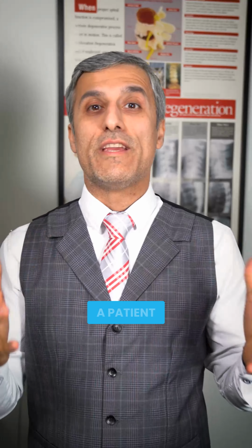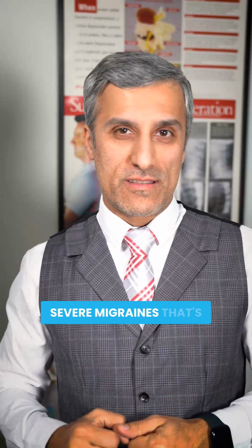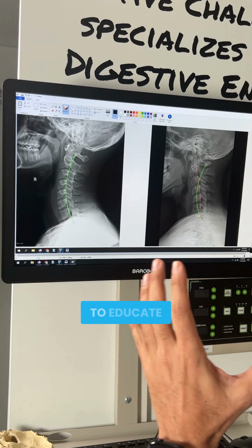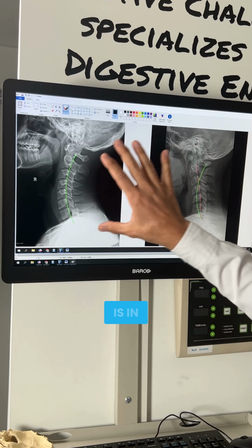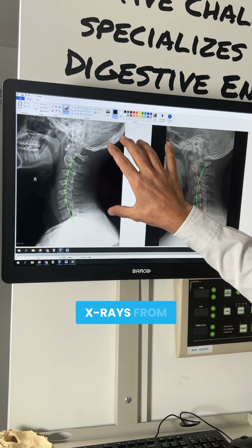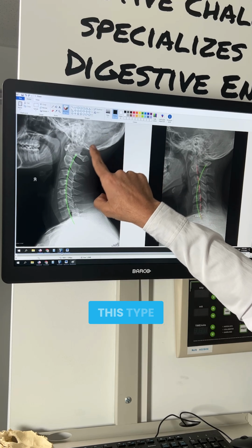I'd like to go over another x-ray with you guys of a patient that I've taken who came in to us with neck pain and headaches, severe migraines that she's been suffering from for years. So this patient comes in, and we again like to educate you guys on what normal is in order to understand what's abnormal. When we're looking at x-rays from the side view, we're looking for this type of a curve.